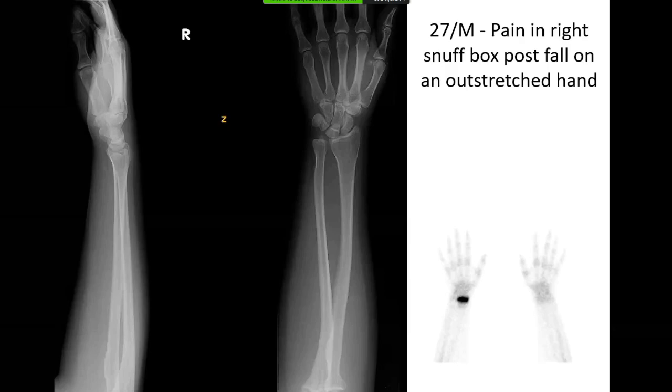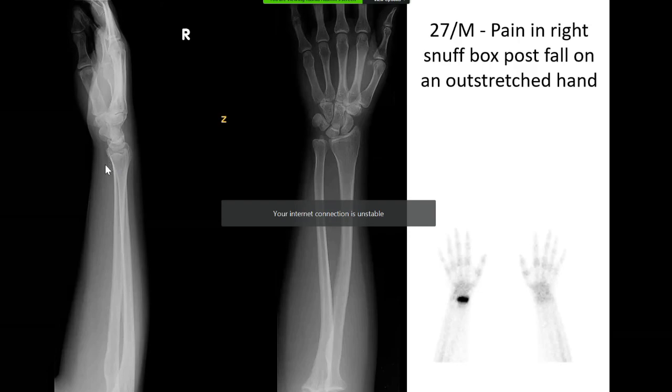No, I actually think this X-ray was read properly. This is a normal X-ray. Remember, this is a young growth plate which has fused, and still you see this sclerotic line out here. So this is not any impaction. This probably was read properly. We don't see much on a lateral view, even going back retrospectively.